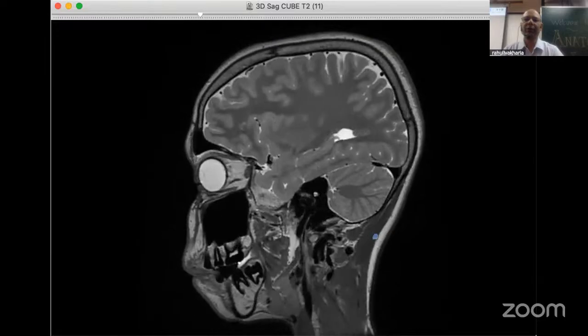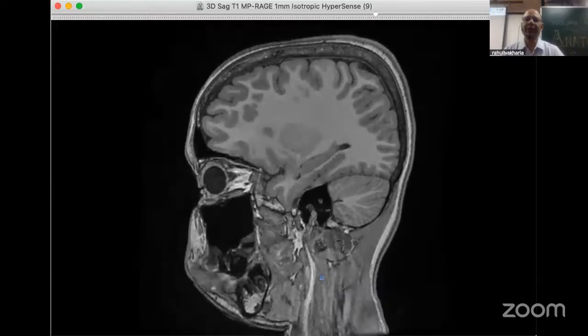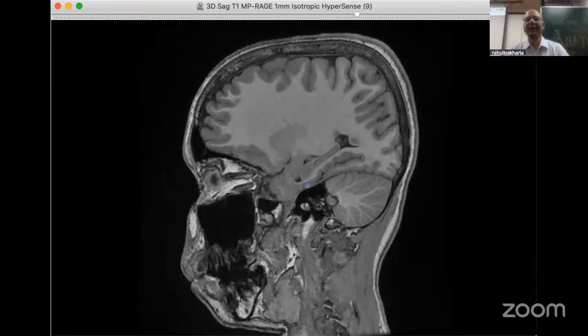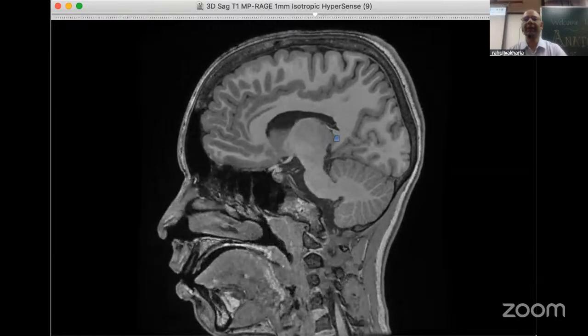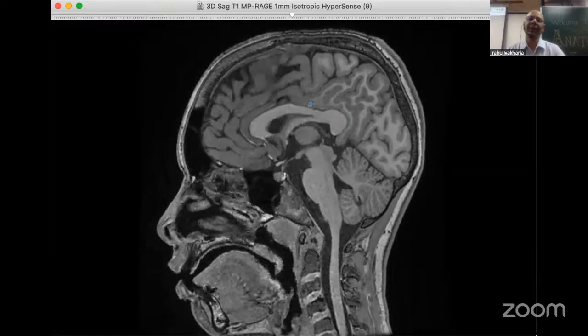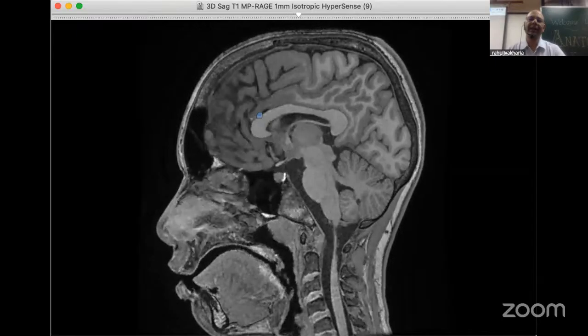I forgot to show you the indusium griseum and the hippocampus. So this is the hippocampus here. This part will continue along above a gray matter, which continues above along the corpus callosum and again ends in the same septal region. So you have 4 arches.